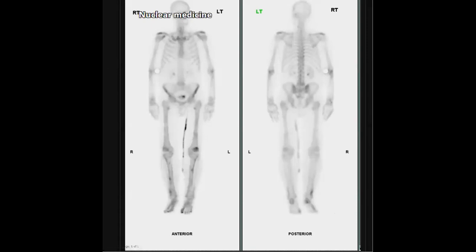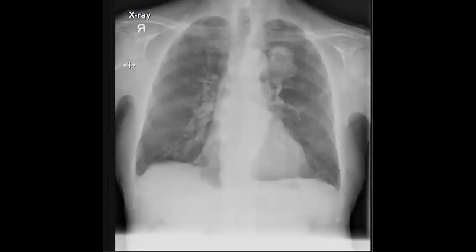First, correlate with the X-ray to check the next step, which is usually the primary source of such appearance, which is pulmonary. Usually they say that a pulmonary malignancy such as bronchogenic cancer is the source, but it can also happen with any other pulmonary lesions. Does everyone agree? Everyone happy? So this is the typical case of hypertrophic pulmonary osteoarthropathy, which is again a frequent exam case.